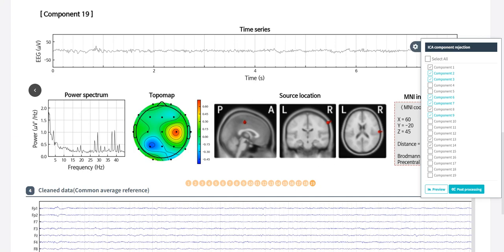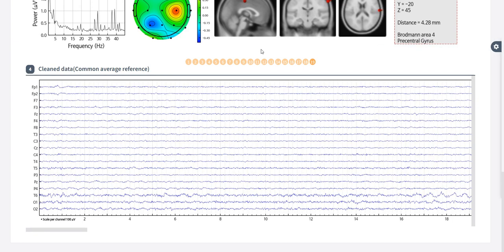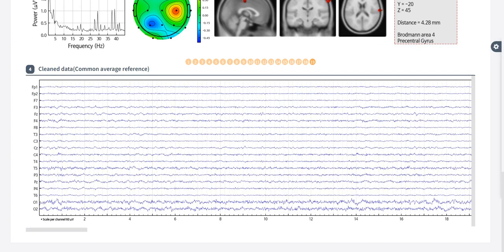And the loading screen will come up for a second, and then it takes a second to update the actual chart. So pay attention to T6, see how we still have all that noise, and then watch what happens once this eventually decides to update. This is just a visual glitch. It is actually processed. It just takes some time for us to catch up. And there we go. T6 now looks a lot more normal. Everything looks larger because it's no longer trying to match how large T6 is, and we have some real brain data.